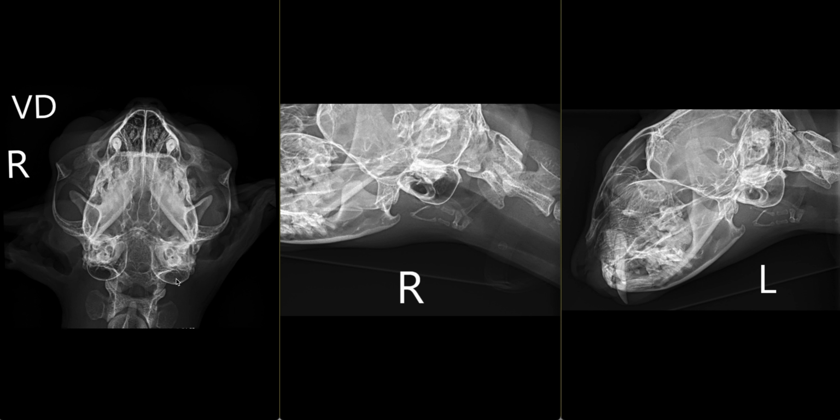The left tympanic bulla is increased in wall thickness in comparison to the right, being sharply defined and thin. There is also increased opacity overlying this bulla in comparison to the gas-filled right tympanic bulla. There is relative symmetry of the diameter of the external auditory canals without evidence of mineralization that can sometimes indicate chronic infection or inflammation.